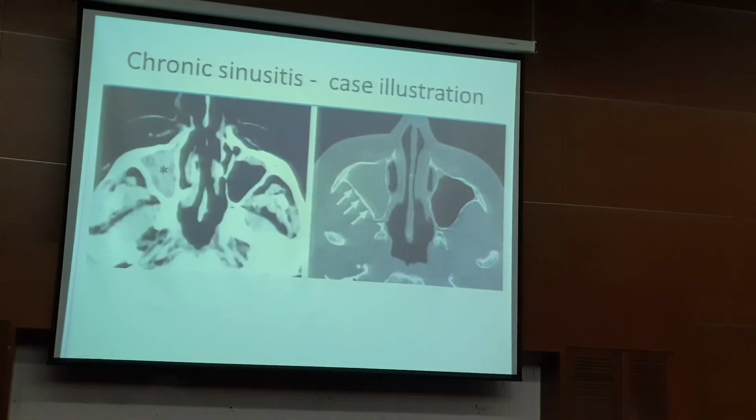Okay, another example here. This is a T1. This is a plain CT, hyperdense with a hypodense outline. This is likely the mucosa, which is inflamed, and again a hyperdense opacified structure in the sinus, most likely benign. It can either be inspissated secretion with or without fungal colonization. Okay, and here you can see the wall thickening. So this is something which is chronic.